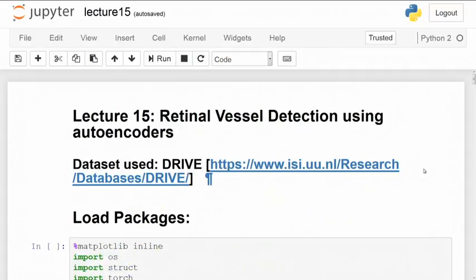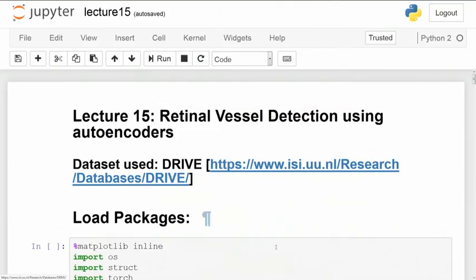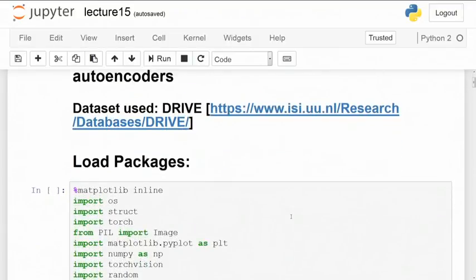Now, for our purpose, when we are training, we will just need the retinal images and the vessel maps in order to train it. And here the point is that it is no longer trying to give a diagnosis out of one image. So, it's not like you have one image as an input to the autoencoder and a class label coming out, but rather there are multiple pixels on the image, and you will have to label each and every single pixel, and that is the challenge we are trying to solve here. This kind of problem, where a segmentation approach is used to annotate and classify each and every pixel on the image, is what is also called semantic segmentation. So, the first step of this is what we are going to do with an autoencoder.